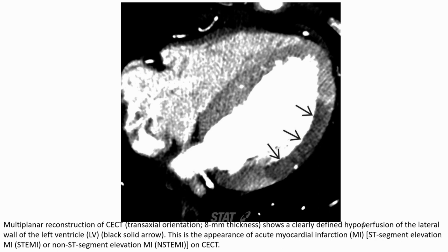The black solid arrow indicates this is the appearance of acute myocardial infarction, ST segment elevation MI, STEMI, or non ST segment elevation MI, non-STEMI, on contrast enhanced CT.